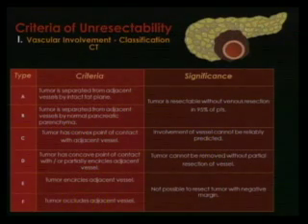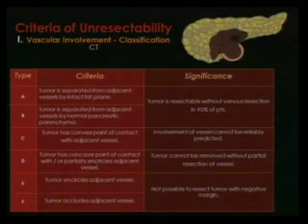E is when the tumor affects all around the vascular structure. And obviously, these are patients that, you know, the tumor cannot be resected with negative margins. The last stage is the one that the tumor occludes the vascular structure, like in this diagram, and you can see, obviously, this is a non-surgical candidate.